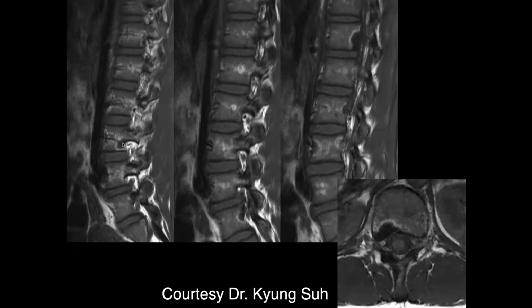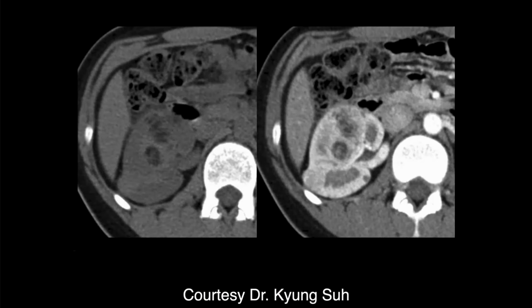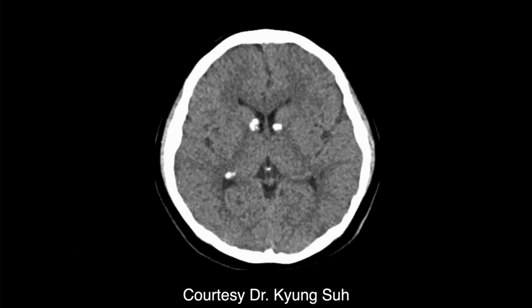So kind of odd appearance, in a lot of different places. So what are you thinking about? Just with that appearance, I'd be concerned about sclerotic mets. Here's what the kidney looks like, and here's what the brain looks like.